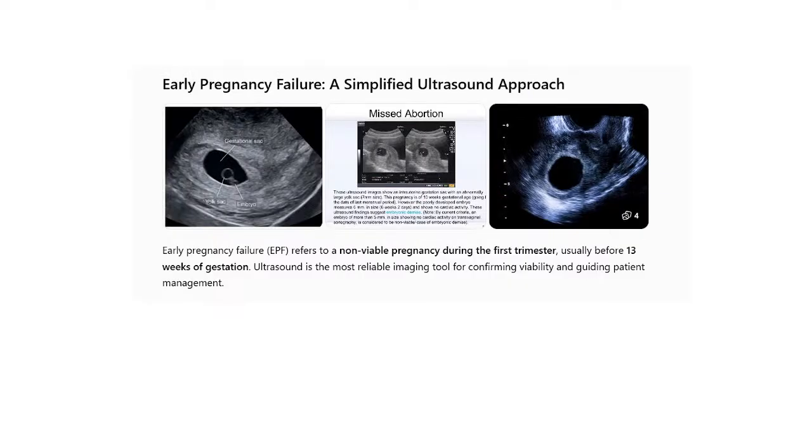Hello, colleagues. How are you? In this presentation, I am going to talk about early pregnancy failure. It doesn't automatically mean that when someone gets pregnant, that pregnancy is going to make it. It's either going to make it or it's going to fail, or there are going to be complications. So, here is a simplified approach to identifying pregnancy failure in the early stages.